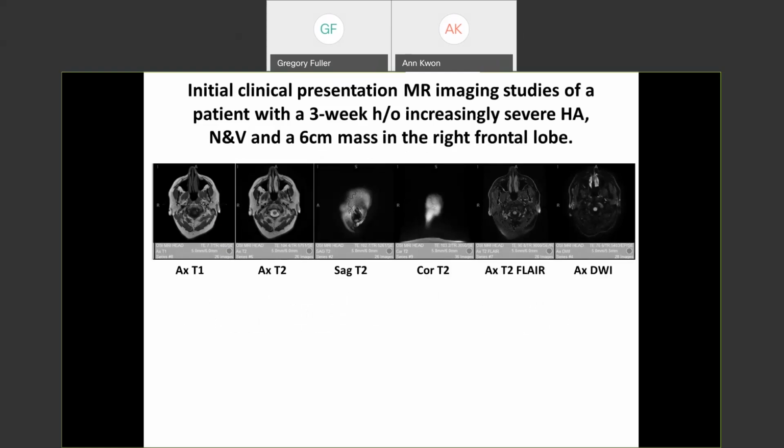There's no lesion here, by the way, in the brain. Can you see? I mean, look at this coronal T2. Seriously, that's what I'm going to show you. But if you use deductive reasoning, if you analyze all the data, if you get granular and you're able to see the forest, not just the trees, then you can pick this out. What's missing? Sometimes it's what's not there that's the key, not what is there. We always want to see what is there, the giant thing that grabs our attention. Sometimes that's not what's important, what's missing.